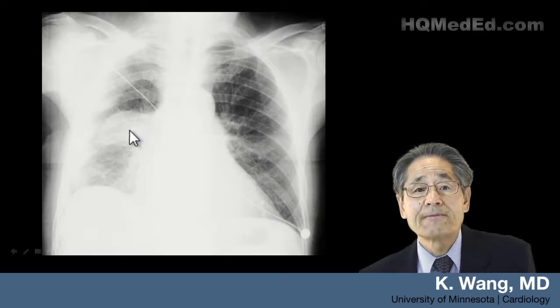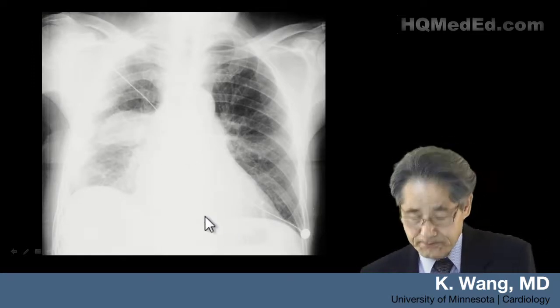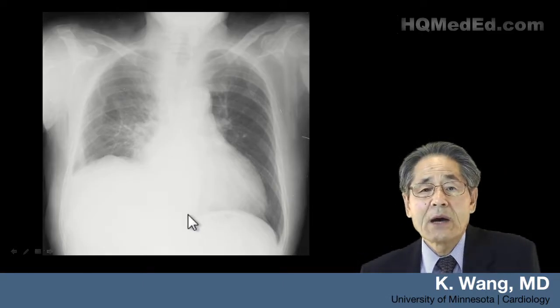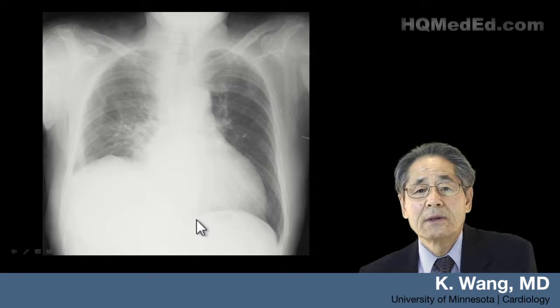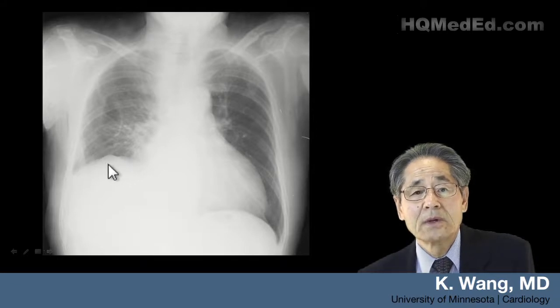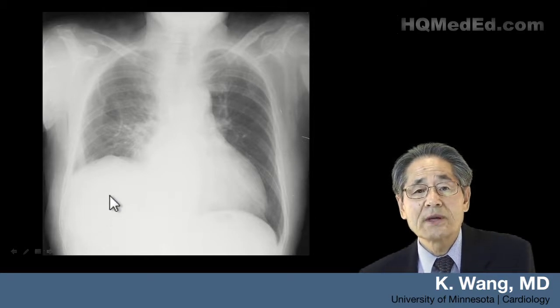Fluid in the minor fissure. Now, what are we dealing with here? Here's a left hemidiaphragm. Is this a right hemidiaphragm? And something underneath the diaphragm? Or is this something else?